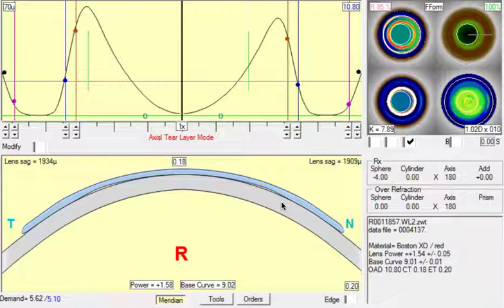In this orthokeratology case, we have a patient who has a spherical refraction, but after treatment has got about a diopter with the rule cylinder. There is about a diopter on the cornea. Since it's spherical in the refraction, we can assume that there's a diopter against the rule on the lens, and so we are causing an additional diopter with the rule astigmatism on this cornea with the current lens.